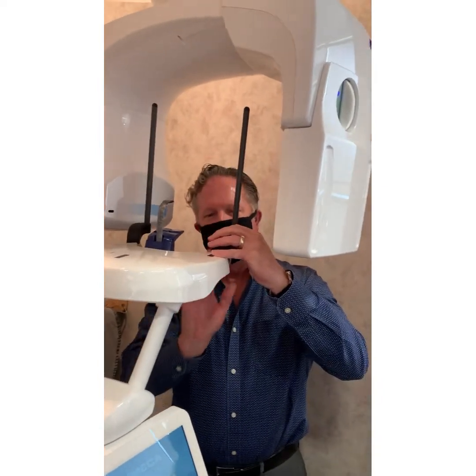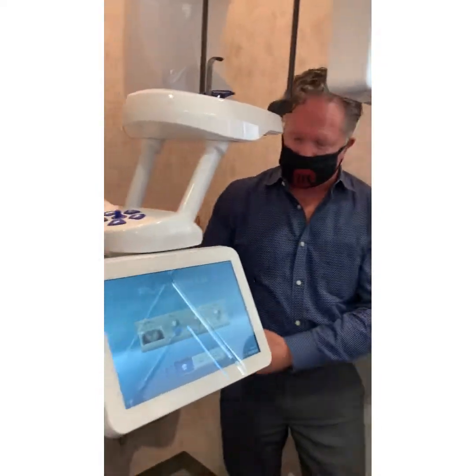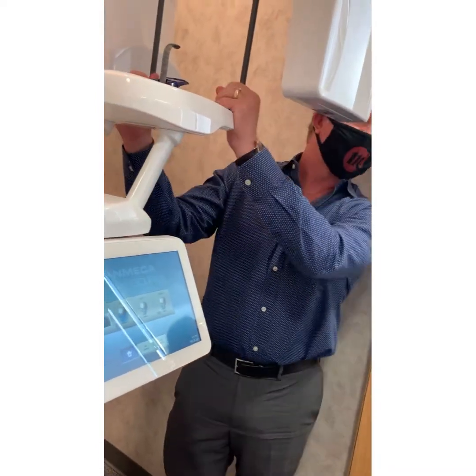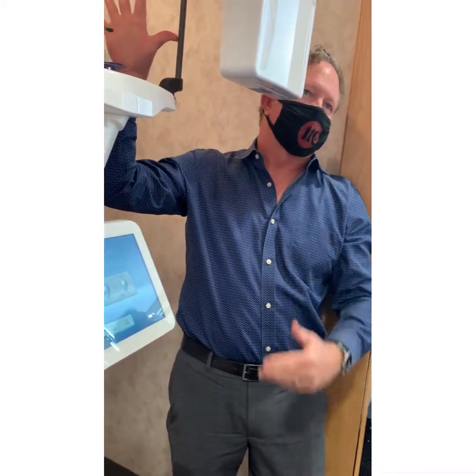Is that a better one? This is the 3D support, but you can use it for 2D and 3D. Officially from Planmeca, you're supposed to swap these in and out. Most of your colleagues' biggest complaint is, do we really have to pull these in and out when we're going from 2D to 3D? The unofficial answer from Doug is no. These radiolucent rods end up outside the condyle, so they don't really hinder anything you're seeing in the pan. And then it allows you to keep one head support on the whole time.